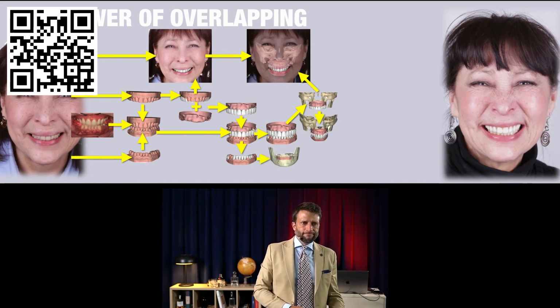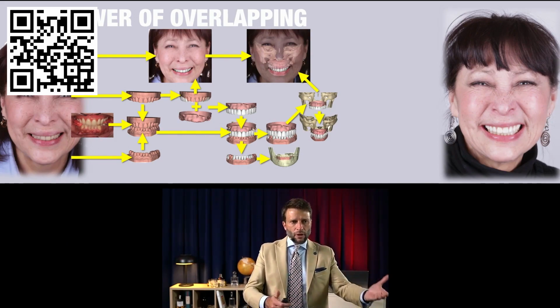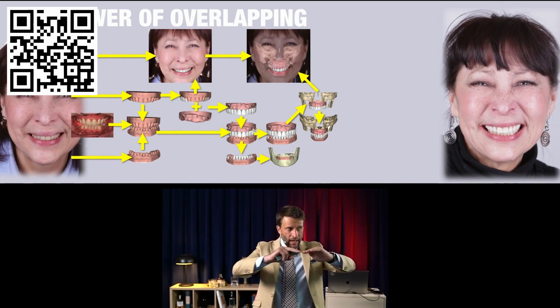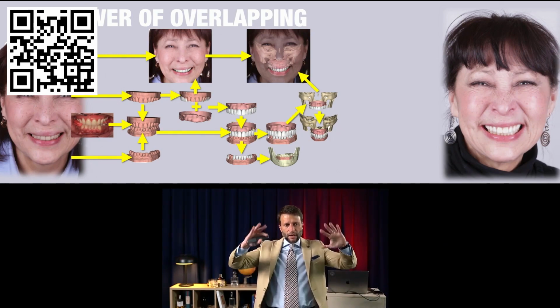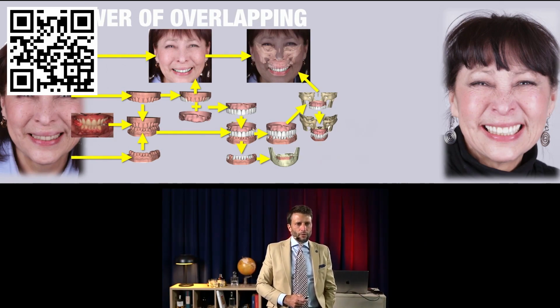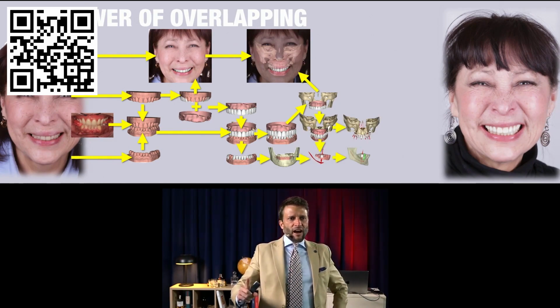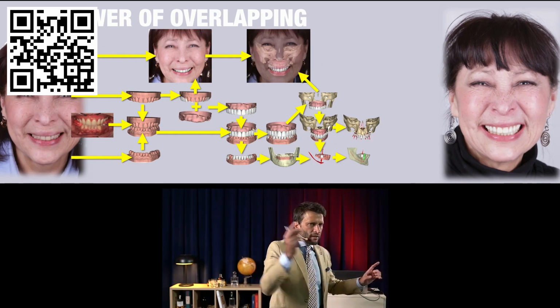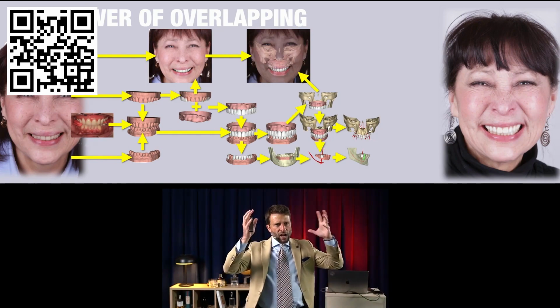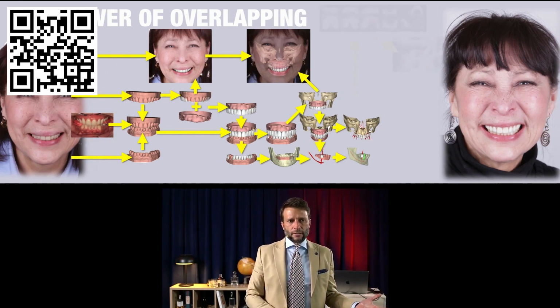We have the bone on the lower. Since it's overlapped to the model, now we can compare the design with the bone on the lower, and we can plan the single implant on the molar of the lower, and we can plan, of course, the new occlusal plane, the Spee curve, the Wilson curve, and the relationship between the upper and lower functional design, and then we can plan the implants. The implants are now planned according to the facially driven design compared to the bone, and if we have limitations and challenges, we can consciously move things around to facilitate the surgery. And this is what we do.